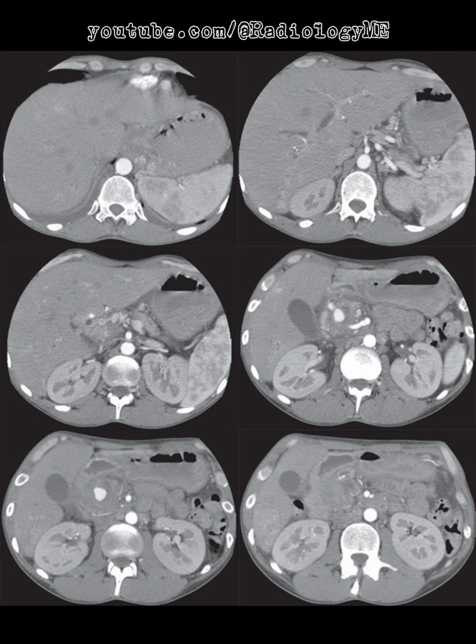Let's walk through this imaging study. We're looking at arterial phase images from a CT scan of the upper abdomen. One of the most notable findings is the poor definition of soft tissue planes around the porta hepatis and the pancreatic head. Within the pancreatic head itself, there's a region of low attenuation. What immediately grabs attention is a vivid, rounded 2-centimeter area of arterial enhancement within that region.